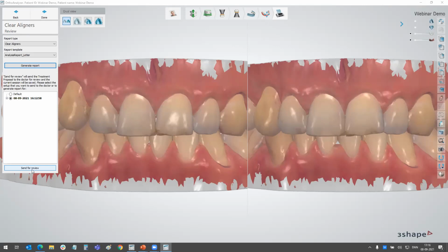But other than that, you cannot really do it, because if you look at for instance the incisors in the upper mouth of most patients, they will be flared out, actually often very, very much. So we could not use the occlusal plane or something to say that everything should be blocked out besides that.